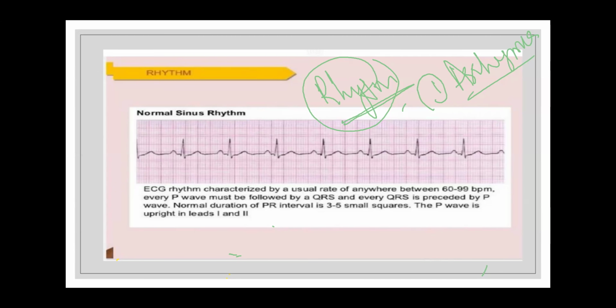Always remember, whenever you see any ECG, these are your complexes, and each should be preceded by a P wave. You can relax, because the current is originating from the normal pacemaker. It is not arising from other foci. Ischemic foci can also produce abnormal currents. So a P wave means it is sinus, coming from the normal pathway.